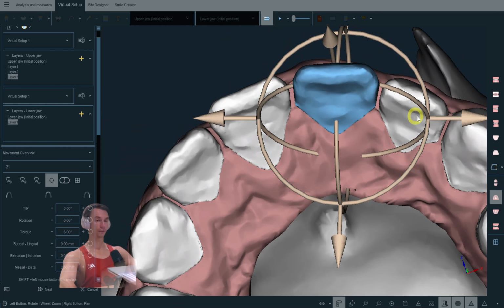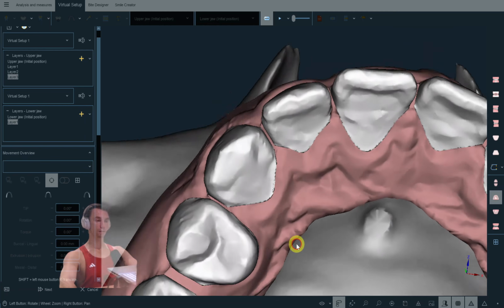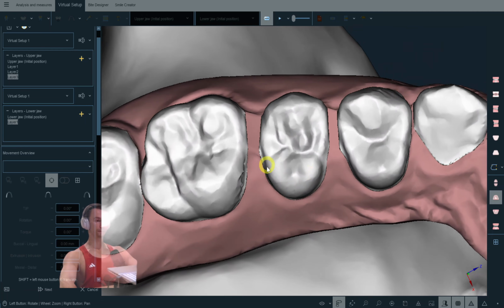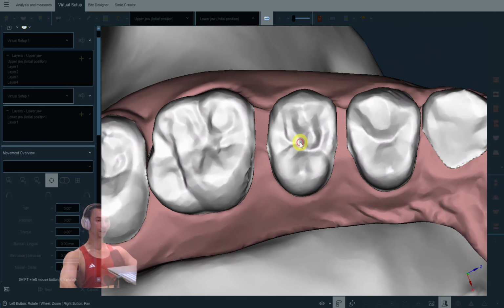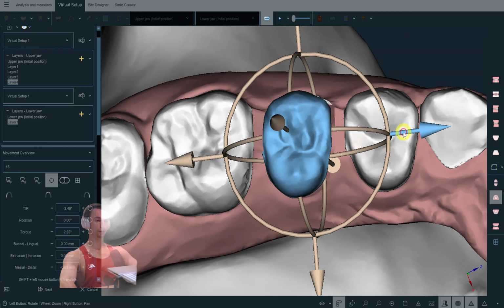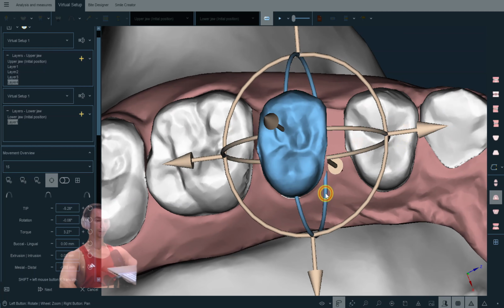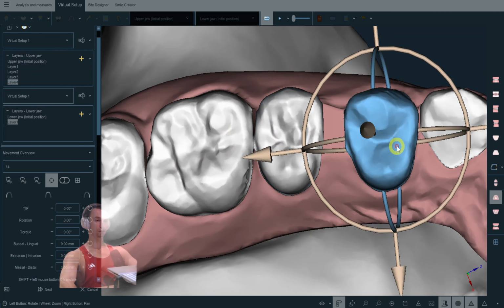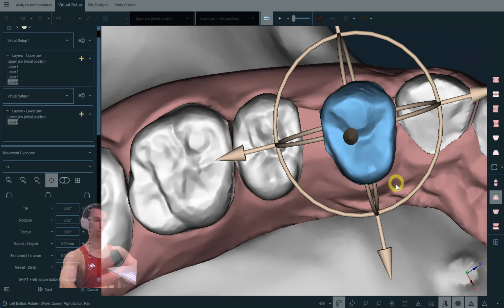We need to think about the consequences and be more realistic in our planning. That's why I combine those movements. I think I've made too much, but we'll check it later.